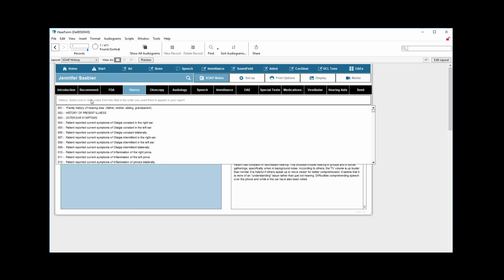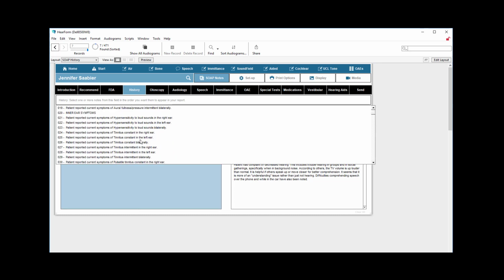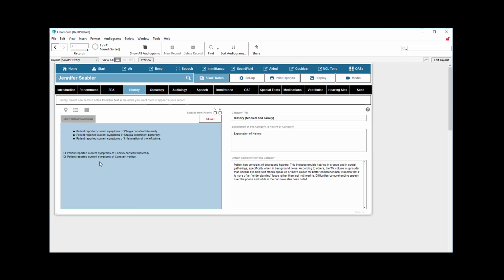close that, and let's try just a couple of those. So notice this is a slightly different kind of bullet point, and I'll put a couple lines down there and choose a different bullet point, maybe this one here. And once again we'll choose something from the list, and that's a slightly different kind of bullet point that's not indented as much. So let's continue.